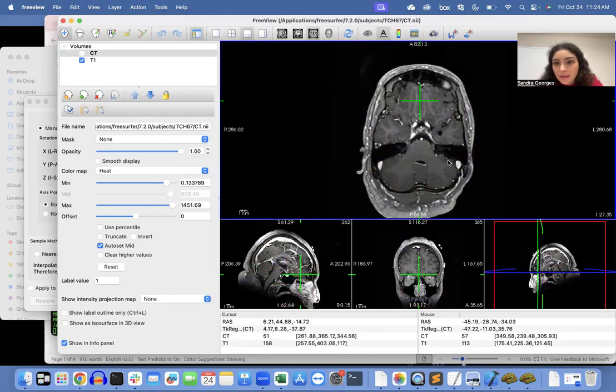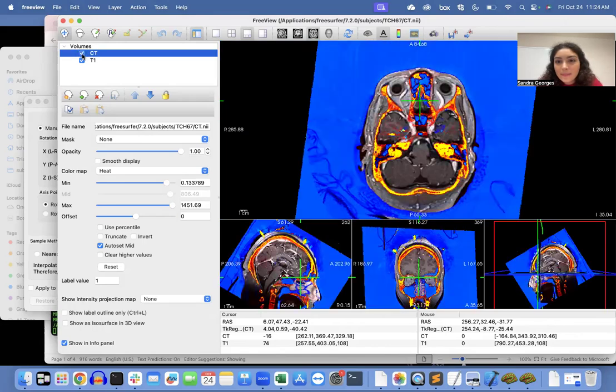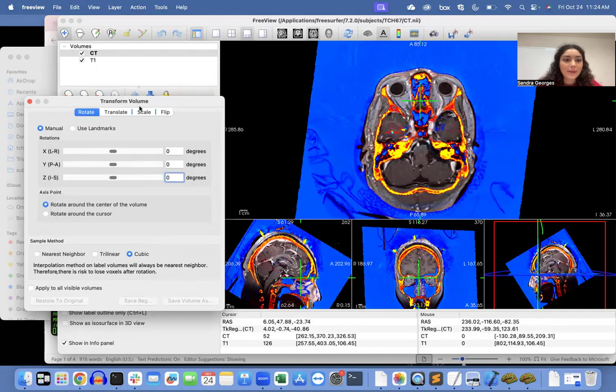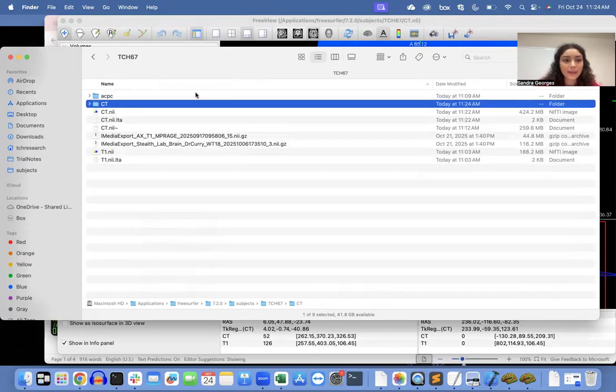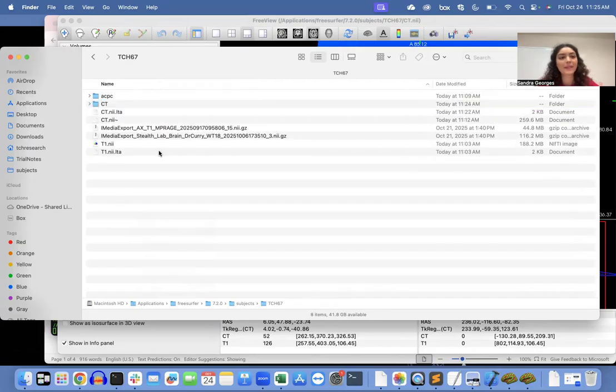So that is what we use. See how these fit into the little sockets here. Okay, so I'm happy with that. So we've saved it, but I'm going to move it to another folder now called CT. And this is the one I'm happy with. So I'm going to move this right into here. Okay, great. So now we're going to move on to the next portion, which is getting our coding.